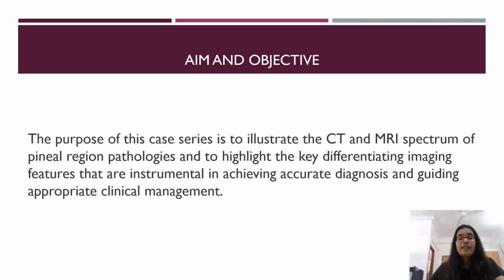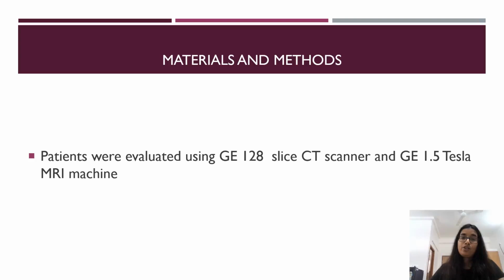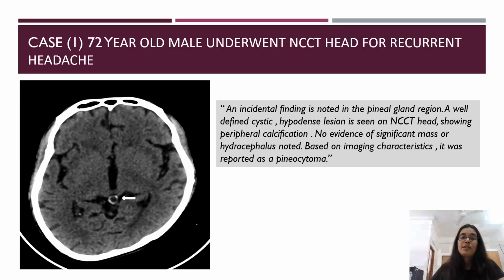The purpose of this case series is to illustrate the CT and MRI spectrum of pineal region pathologies and to highlight the key differentiating imaging features that are instrumental in achieving accurate diagnosis and appropriate clinical management. The patients were evaluated using GE 128 slice CT scanner and GE 1.5 Tesla MRI machine.